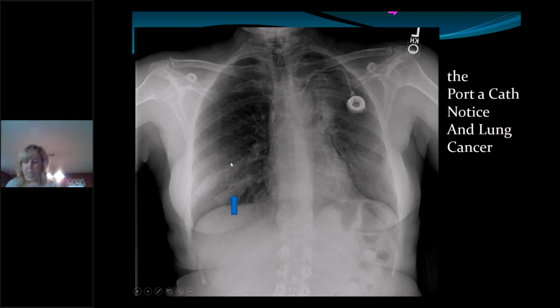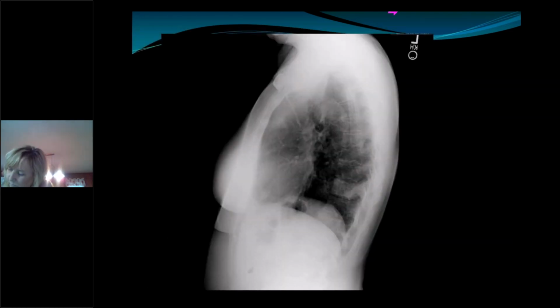which is irregular. Well, if that didn't sell you enough, you've got the lateral because you listened to this course and now you're smarter. And as we look at the lateral, and it goes from light to darker to what is this big thing? Because that's not the diaphragm. Diaphragm's down here, heart's up here. What the heck is this thing that my cursor's all over? So you would have got the lateral view and looked at it and gone, holy cow, something nasty's going on here.